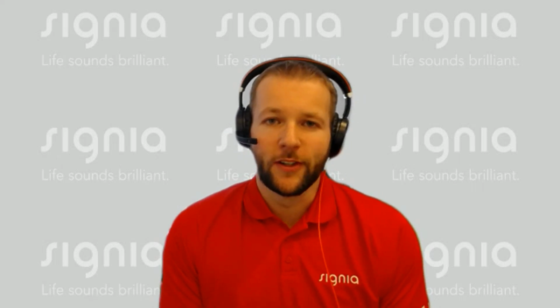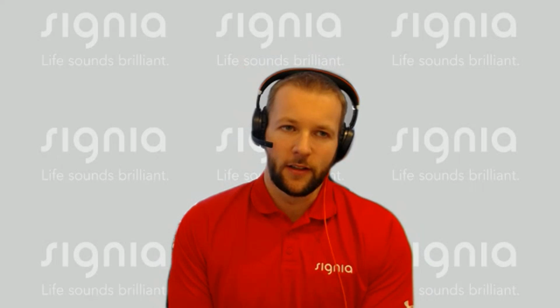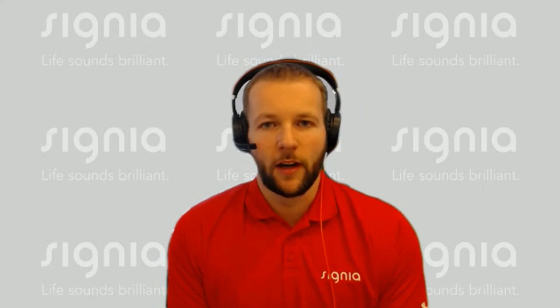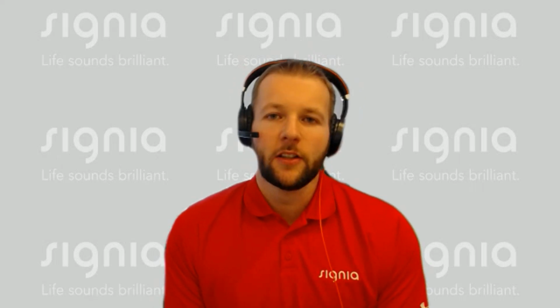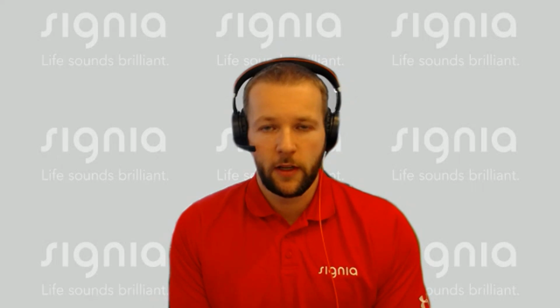I'm sort of proud to introduce our new e-com platform to you, which is called MySignia. Here on the MySignia site, you'll be able to do a lot of different things for your clinic. So you'll be able to place new hearing aid orders. You'll be able to check on your order history.